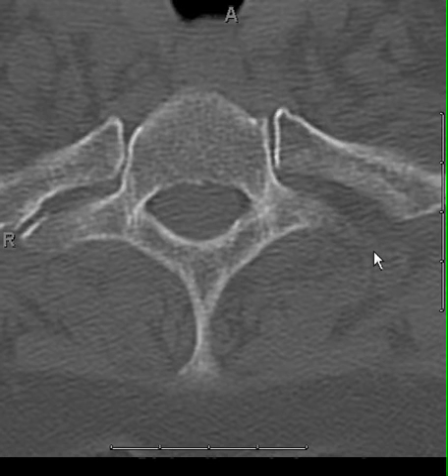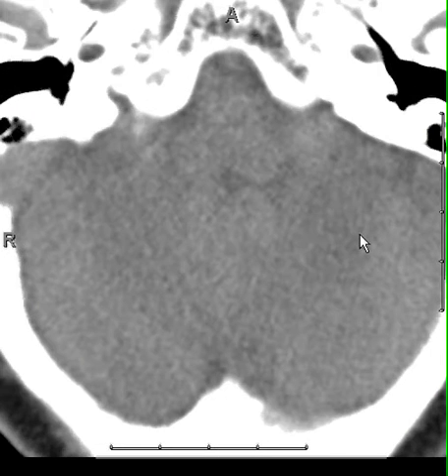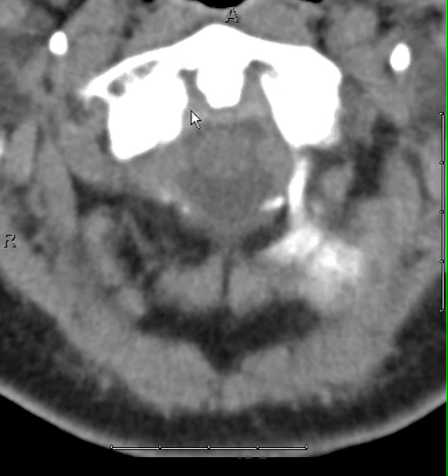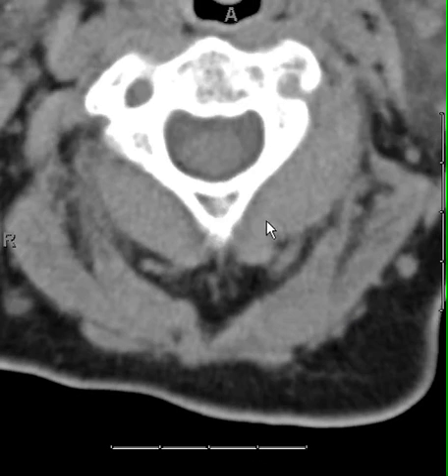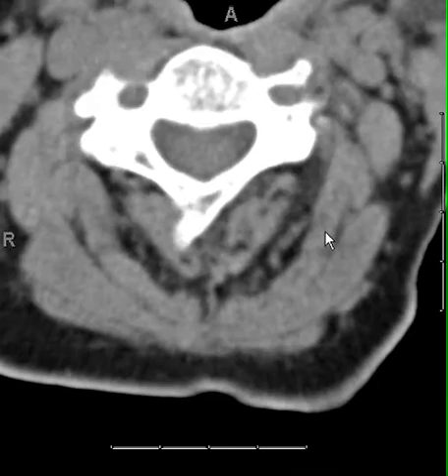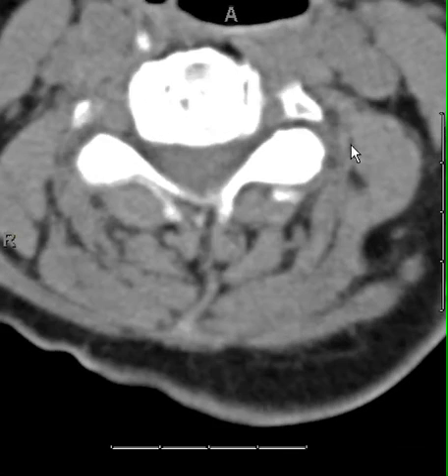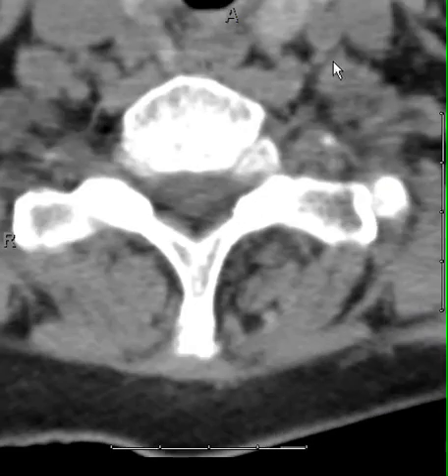So that's basically it for the bones, and now I'm just going to go and look at the soft tissue windows just to make sure that I haven't done anything crazy and missed something silly. So this is another great chance to look for epidural hematomas, which are generally pretty bright, but this is coned down pretty tightly, so we don't have to look at a lot of things, which is kind of good sometimes, but we're looking for enlarged lymph nodes, we're looking for thyroid lesions, and that kind of stuff.